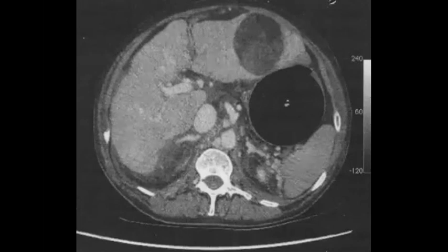Yeah, that's why I told you that even with liver cirrhosis, the best differential diagnosis to put will be again HCC, because there is a category called fat-containing hepatocellular carcinoma.